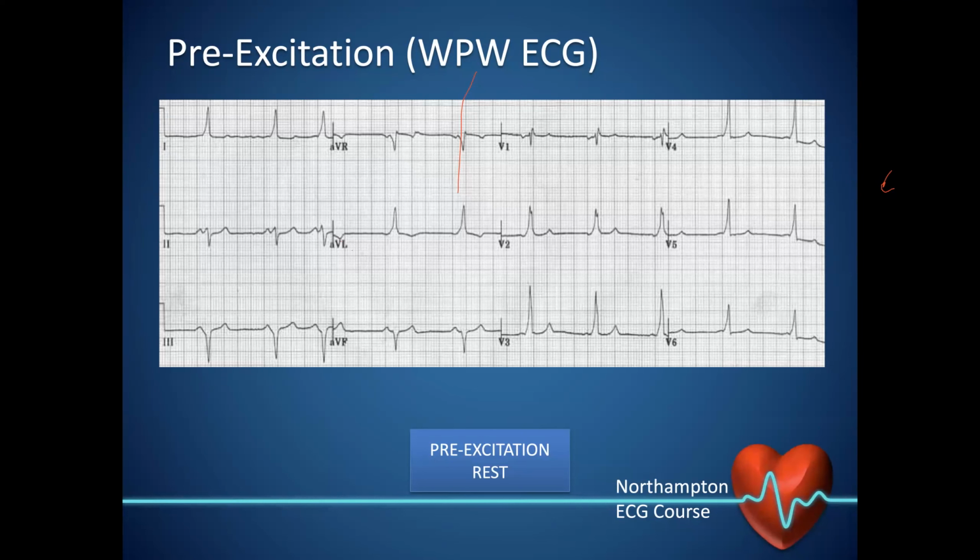Great, just quick. I know you've spoken about this, but I just want you to clarify for people who are learning about ECG: on an ECG tracing, when you see the slur in the delta wave, that's called a manifest pre-excitation. Manifest. Overt is the term.